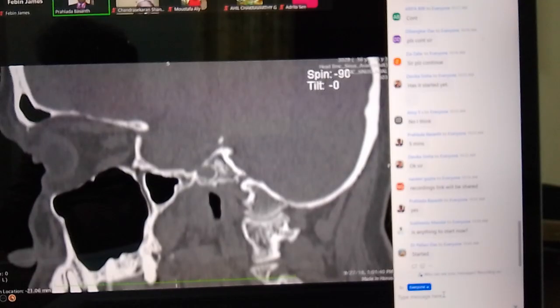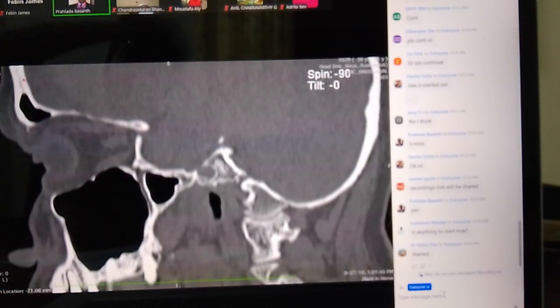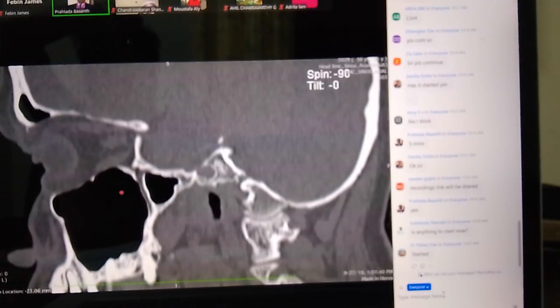Okay, and further medially what we get here, this is the frontal sinus and frontal bone, roof of the orbit. Okay, maxillary sinus, pterygopalatine fossa, and this is the pterygoid pneumatization, greater wing of the sphenoid medial portion, and this is a cavity like the same. This is the fossa of Rosenmuller. Okay, fossa of Rosenmuller. Yeah, and further medially.